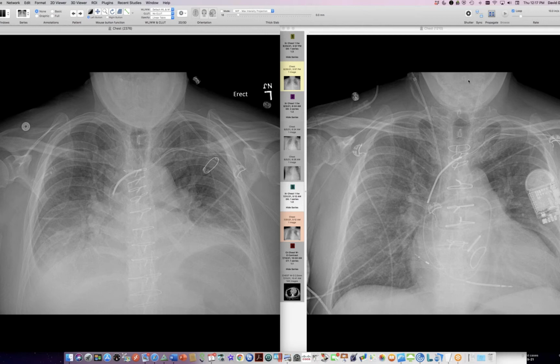So I hope people can see two radiographs here. This is a heart transplant person. The radiograph on your right was before the transplant. At this point, there's already been surgery with 2 valves in place and a defibrillator in place. And people who've had previous heart surgery, often it's an LVAD, on their way to transplant, have a higher rate of complication that involves the diaphragm. So I think that previous surgery creates enough scarring that when they try to do a transplant and remove the heart, they end up having the phrenic nerve maybe encased in scar and tearing.